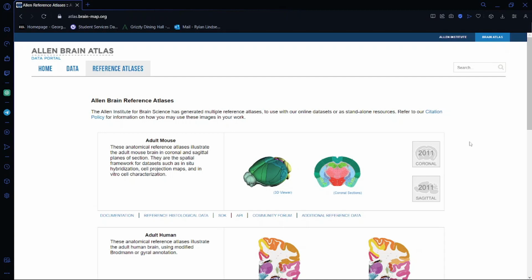I'm a student at the Georgia Gwinnett College School of Liberal Arts studying cognitive neuroscience, and today I'm going to be showing you how to find cortical volume using the Human Connectome Workbench.